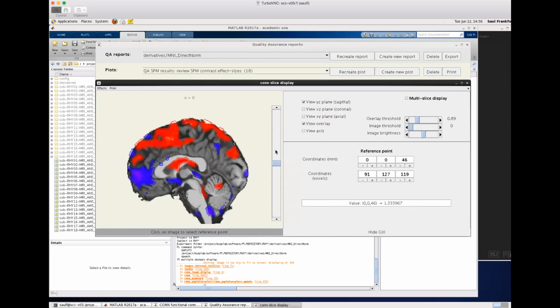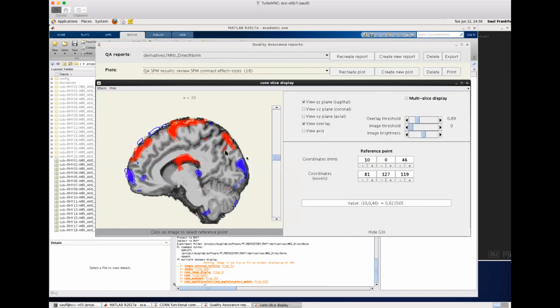When you have motion like this, when I look at the way the activation is lining up with the anatomy, I would want to go back and really check the co-registration. Did the normalization and co-registration work well? If a subject moves a lot, Alfonso, that would seem to affect those other operations as well, right?